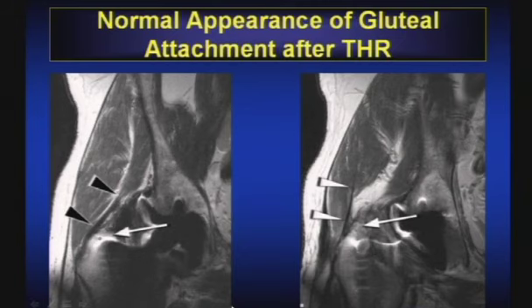This is sort of a segue or a teaser, your appetizer with respect to our future discussion within the next half hour or so that will talk about imaging around metal in the hip. So you see that we can image around metal. We just have to try to tailor our standard clinical sequences in an effort to decrease artifact enough to evaluate the tissues that we need to.